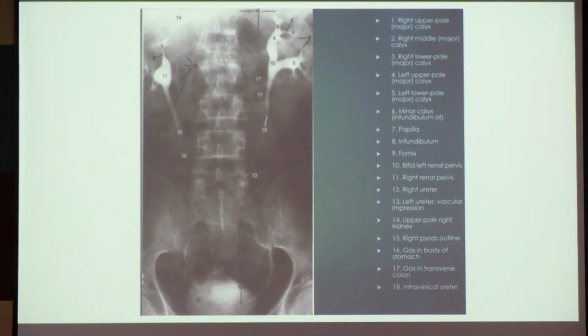This particular outline, you can see, is very faint, but that is actually showing the level of the kidneys. Apart from that, this is the bladder where it has actually already entered, and this is the pelvicalyceal system. This pelvis is not the normal pelvis. This is a bifid pelvis. A normal pelvis looks like this, a balloon shaped one with all the three areas coming together. Here we can see there are two different ones at right angles. So this is a bifid pelvis.